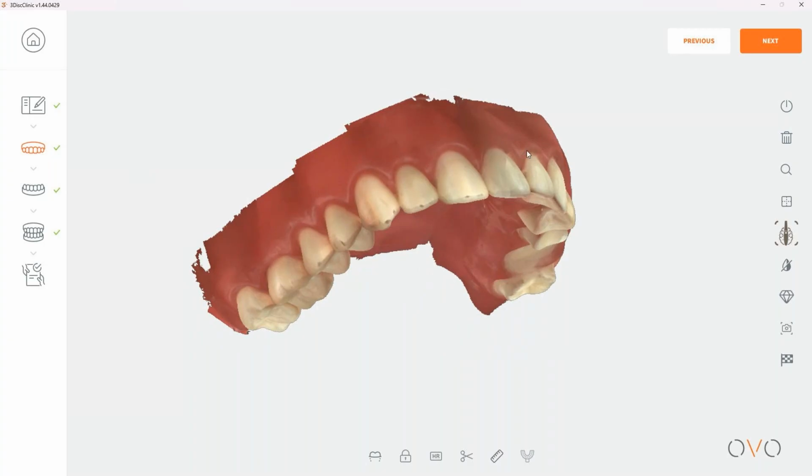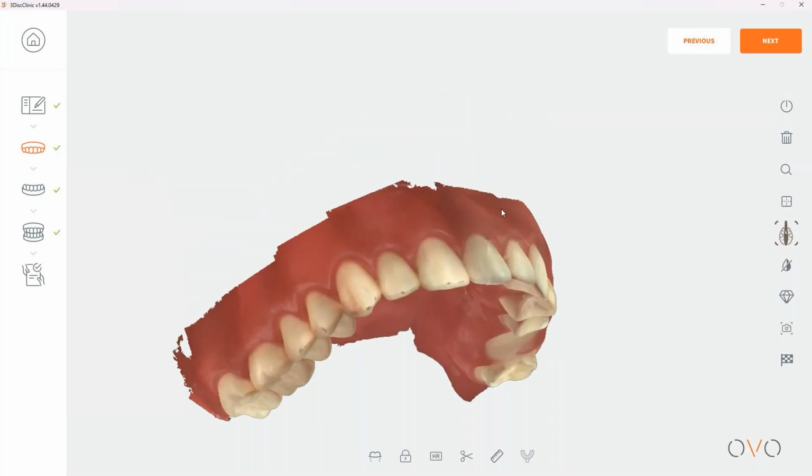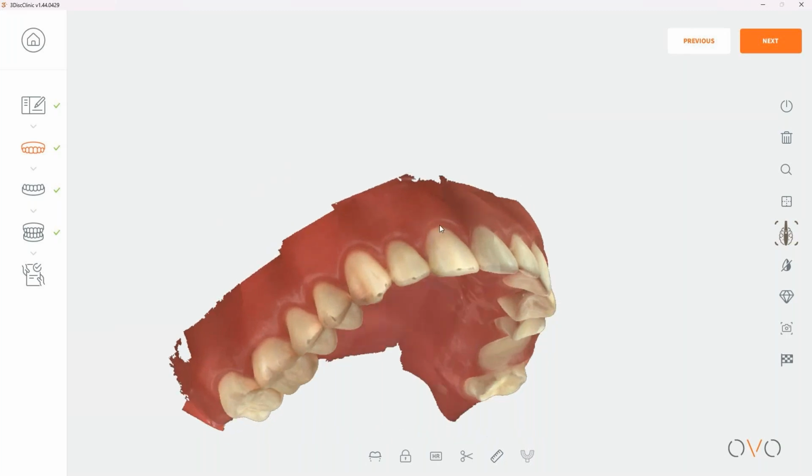So let's go ahead and we're going to now address disable color and quality map. You'll see here within the software, we're in the scan stage over here on the left-hand side. The workflow is here on the left-hand side. It starts with the order form. This is where we go through the details of adding basically the workflow, what we're actually going to be addressing with the patient.